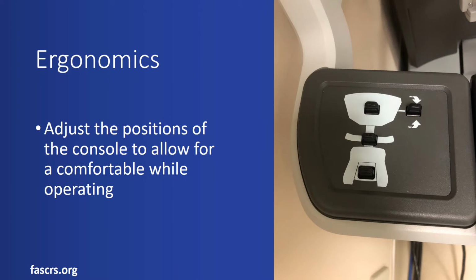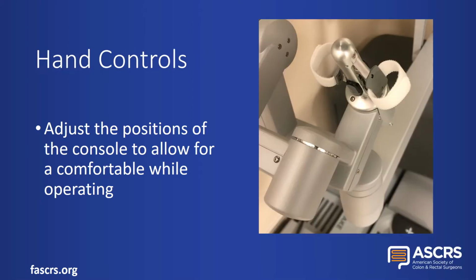On the left side of the armrest, these buttons allow for ergonomic adjustment of the surgeon console, including the height and angle of the viewfinder, the height of the armrest, and the distance of the foot pedals. These ergonomic settings can be changed at any time to optimize comfort, and a surgeon-specific setting for these items can be saved in each surgeon's profile so that it returns to that position automatically when logged in.